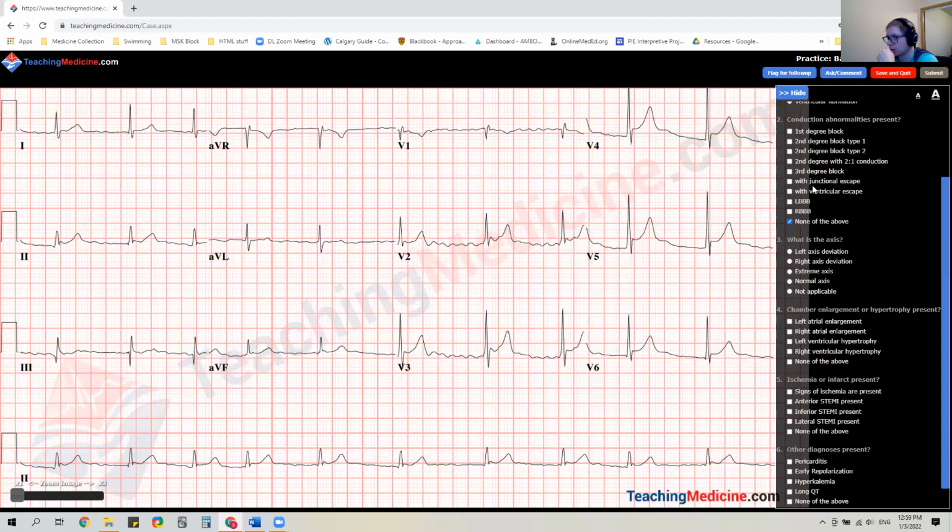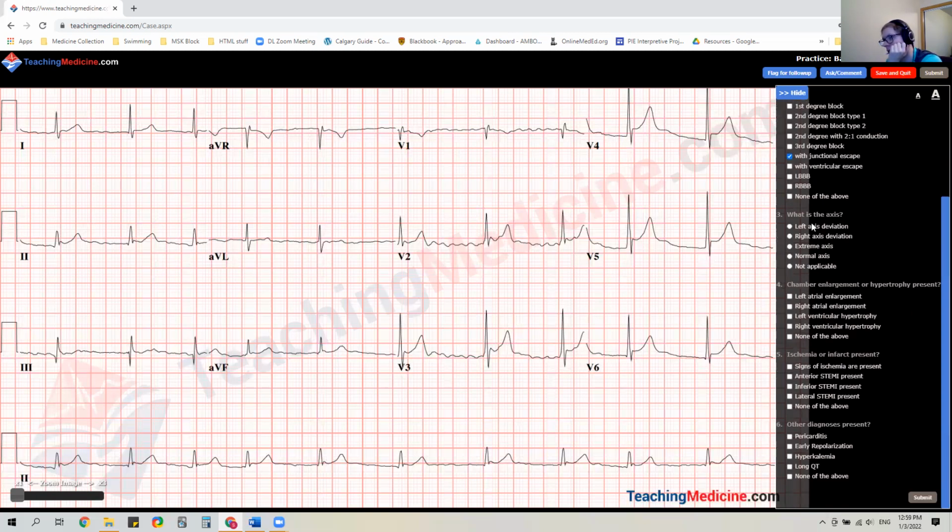Would it be junctional escape? Might be, yeah, with junctional escape because it has to get through. Axis was normal, I think. I didn't see any hypertrophies. I wouldn't say those. I would say it's pericarditis.